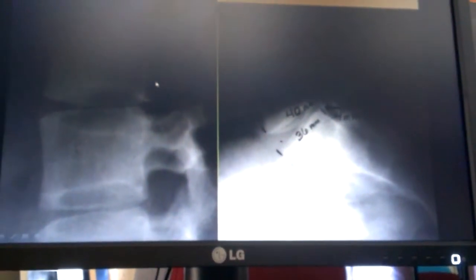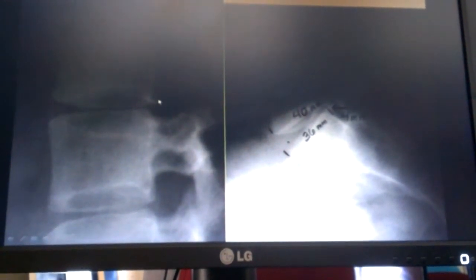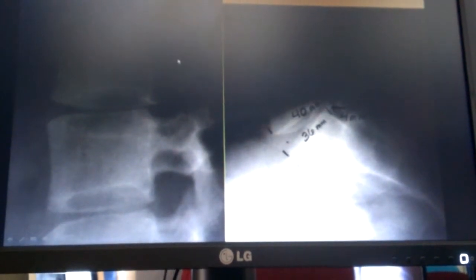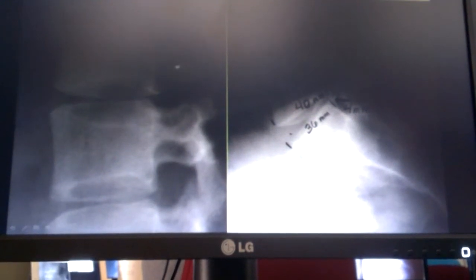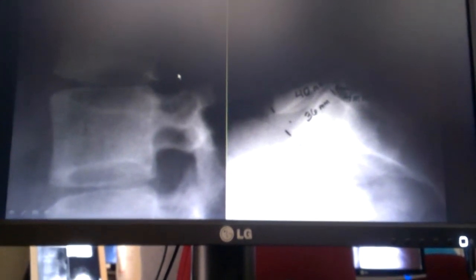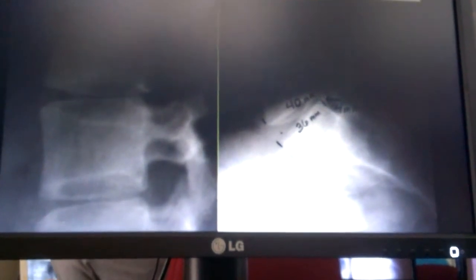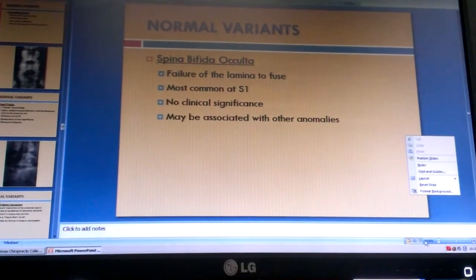So you can see conceivably, if I pick up this cortical margin, and then I've got to come forward to pick up this one, I would think that this is retro. But here is the same cortical margin right there of the two vertebrae. And you can see there's some lateral bending, right? Because here's the top of the IVF on one side, the top on the other side. So there's not just rotation, there's rotation and lateral bending, which makes sense if you've got scoliosis. Usually the apical vertebra is rotated the most in that curvature. So here again is a lateral flexion. Okay, so that does that. There. So that was the biggie.